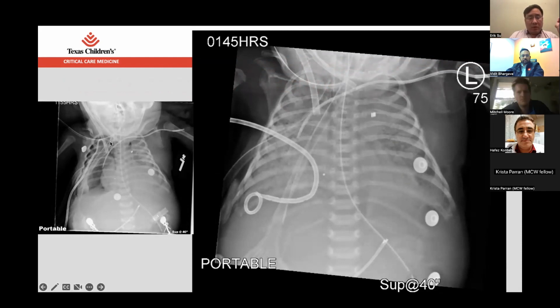But then, this is the pre and this is the post on the right. And so the pleural drain comes in this way. The wire was a little aggressive, went all the way down to the base of the lung. But once you're in and you have this oblique track, because the baby's chest wall is so thin, the oblique track makes it easier for it to seal off. So you don't end up having a very wide and short track that could leak a lot. So you've got this long tissue track that'll help be protected from that standpoint.